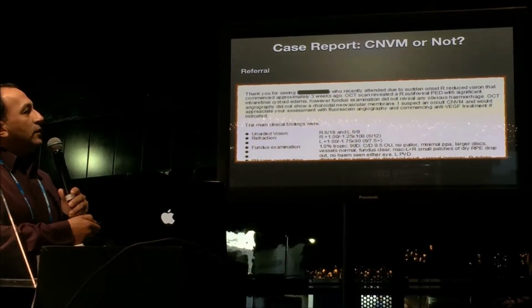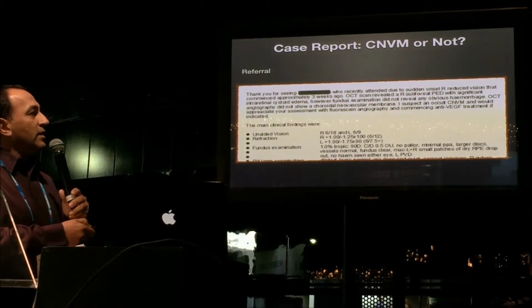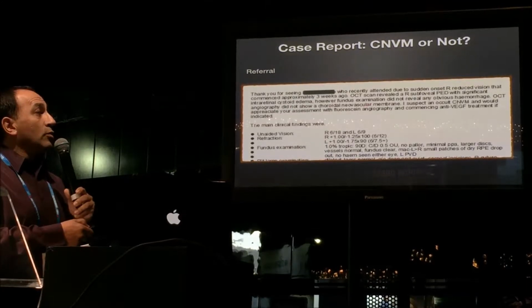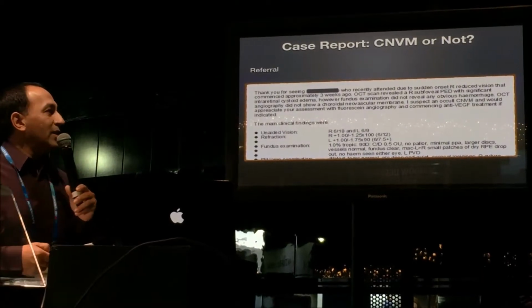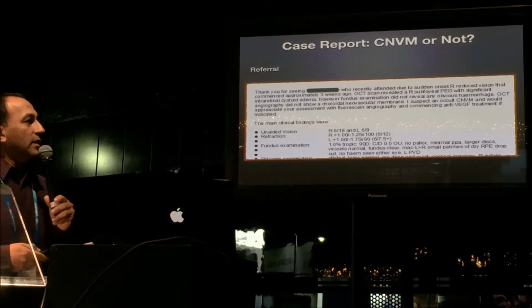Thank you for seeing this patient. His OCT scan revealed a PED with intraretinal cystoid edema. Fundus exam did not reveal hemorrhage. OCT angiography did not show a choroidal neovascular membrane. I suspect occult CNVM and would appreciate your assessment with angiography and commence anti-VEGF treatment if necessary.